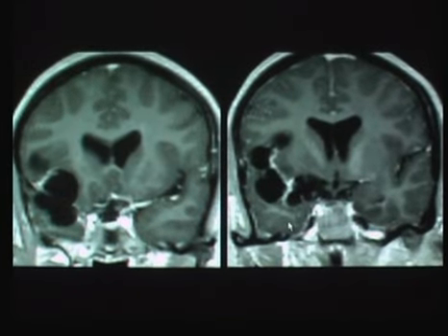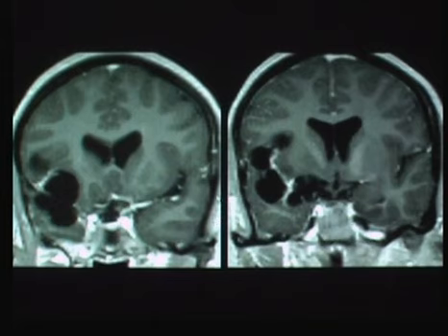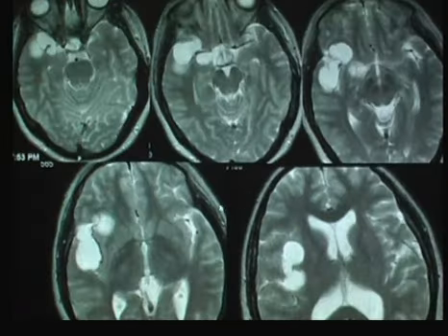Here's an interesting appearance of the subarachnoid variant of disease, or racemose neurocysticercosis. And you end up with a multiloculated appearance of the extraaxial spaces. You can see here the Sylvian fissure looking bizarrely dilated in this multilobulated form. In the same patient, we see on the T2 weighted imaging the same appearance with splaying of the flow voids in the middle cerebral artery.